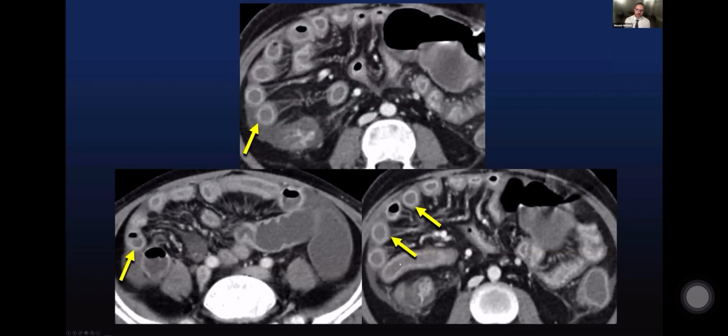I think on a good day, we might suggest that this is graft versus host disease, which is what this happens to be. But you have increased odds of getting that diagnosis if you look at the patient's history and realize that they're neutropenic, that they just got a bone marrow transplant, that they're the exact patient population who might get this, and that helps you be a little bit more specific.